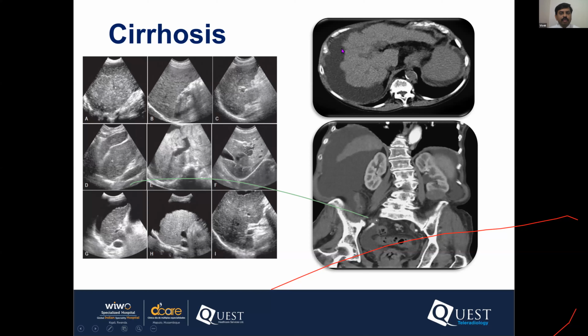And coming to the CT, we see all the features on ultrasound as well as the selective left lobe hypertrophy and the right lobe atrophic features. Then we see surface nodularity, which is very well appreciated. We can see splenomegaly on CT very clearly, then moderate to massive ascites. And then we can also come across portal venous hypertension features and portal vein thrombosis, which are again vascular disorders.